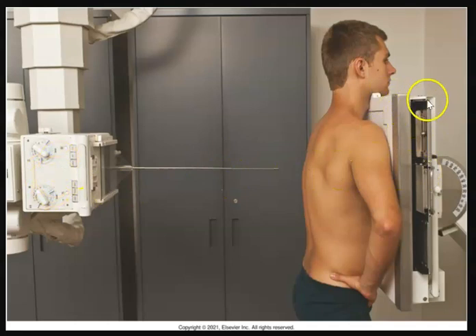And then over here we have the wall bucky. You can't see it very well from this angle, but this is a handle. What you're going to do in lab is pull out the wall bucky. And what you do is you pull on this handle, and this is a tray that slides out. You're going to put an IR or an image receptor into this tray so that it can capture your X-ray. So when you have all of this set up, you have this X-ray tube lined up with your bucky, your patient all positioned, and you go to press that button, that IR that you slid into this tray will capture your image so that you can process it and get it on your computer screen.